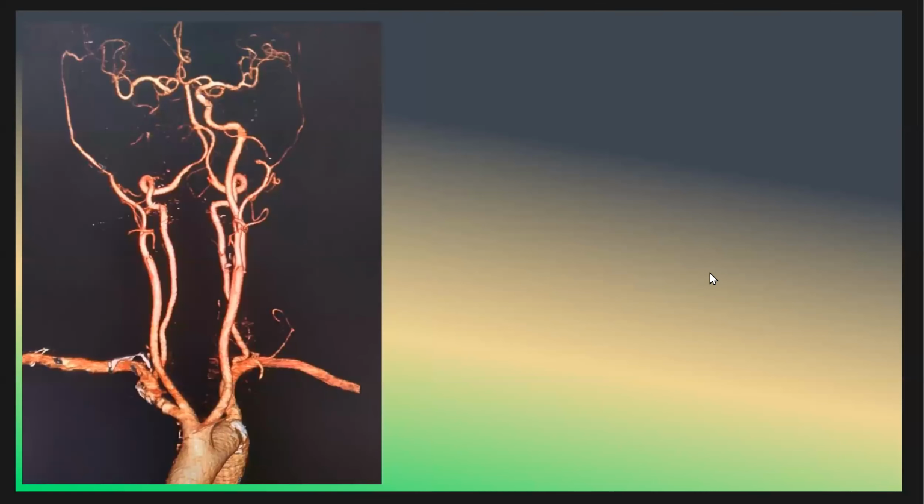Okay, next case. This patient has non-visualized internal carotid artery from its origin. You see here, this is the internal carotid artery on the left side, and on the right side, we cannot see it. This is the vertebral artery, and this is the external carotid artery. No internal carotid artery on the right side.